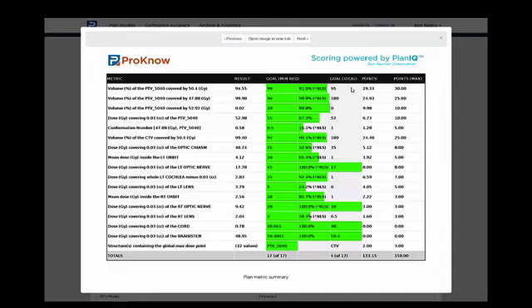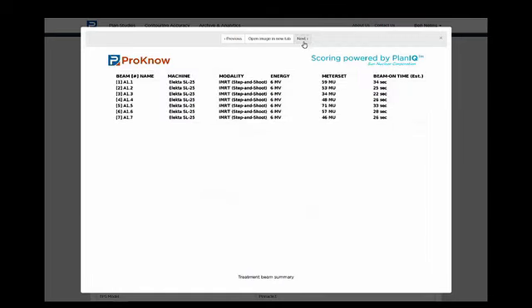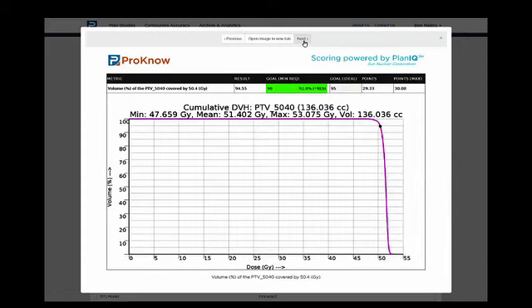Did you hit the minimum goal? Did you hit the ideal goal? And what was your progress in between? Your points and the total possible points, or weight for that metric. You can go through then each and every metric. There'll be a summary of your plan. This was a 7-field IMRT case. And then each and every metric will be examined.